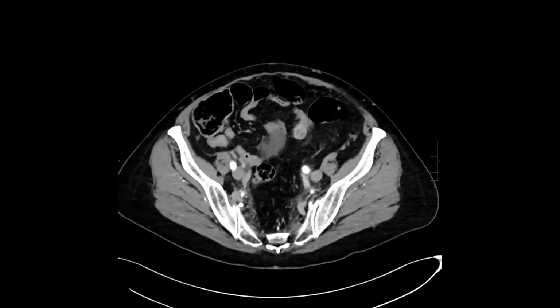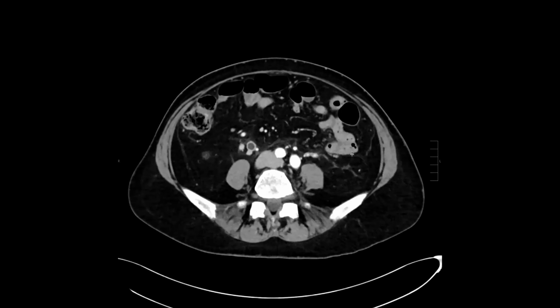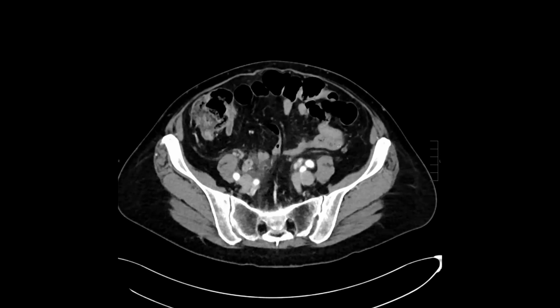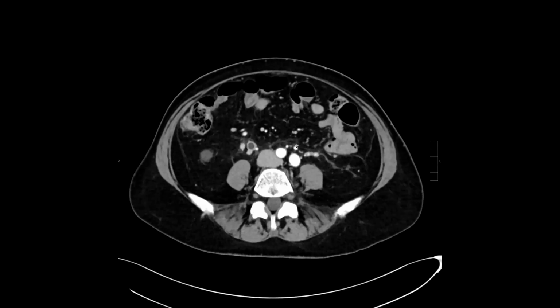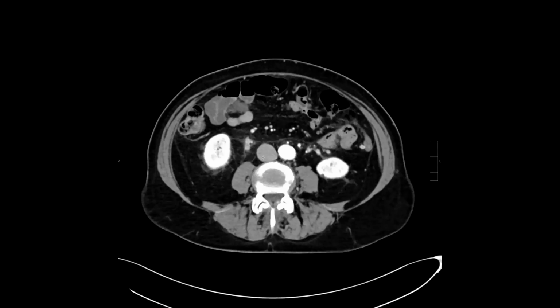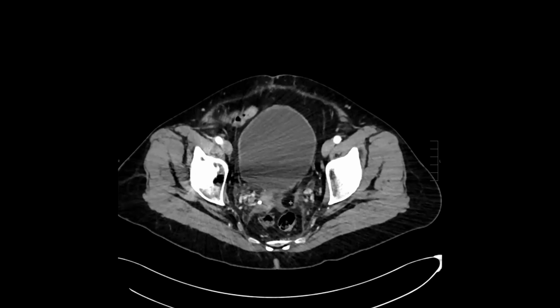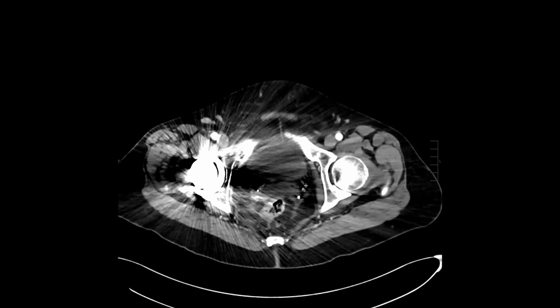A patient came into the ER with a UTI. Gonadal vein thrombosis. Okay, yeah, that's a good thought. So let me see, where is a gonadal vein? It would be somewhere coming off the IVC. But this one goes all the way down into the pelvis. It's like septic thrombophlebitis that is from the internal iliac has traveled up.